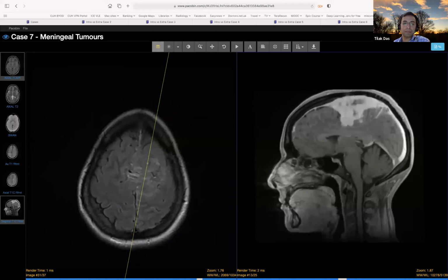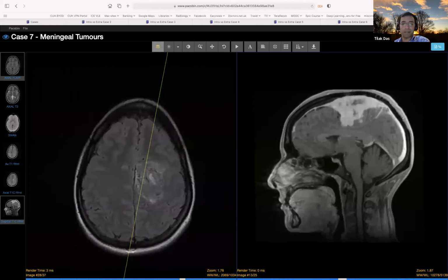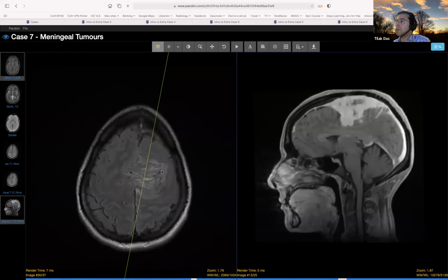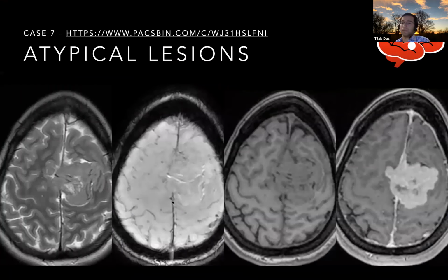And we had some thoughts of very high T2, very low T2. So thought it was somewhere in between. I didn't find that particularly helpful here. Maybe no atypical signs. What do you think the diagnosis was? Of course, if we're talking about meningiomas, the first abnormal case that comes up is almost always hemangiopericytoma, isn't it? But you're absolutely right. So these flow voids, I think, are particularly helpful, although we have a few cases of hemangiopericytoma where they just look like meningiomas. So these can be difficult.